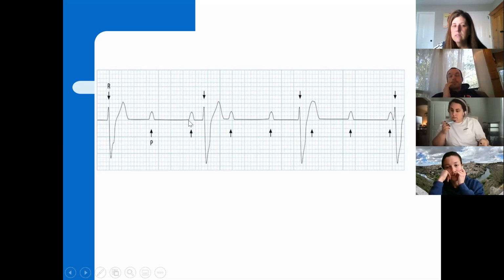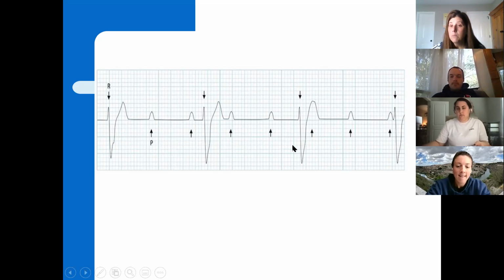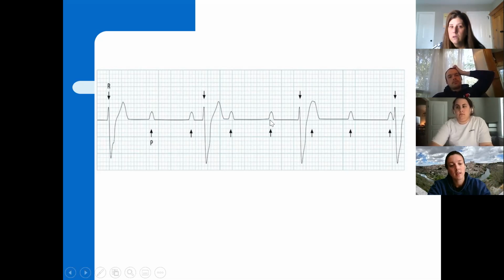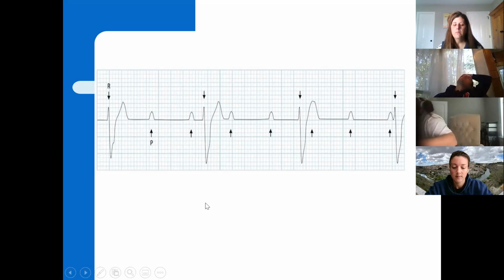And you have to notice that the PR intervals are not progressive like they were when we saw them in second degree type 1, longer, longer, drop. We have a lot of QRSs that aren't coming through. But again, it's because they're functioning independently of each other, the atria and the ventricles. But we do have random lengths of PR, like PR here. There's no way to measure this one because there's no QRS. This PR is long. This one, I can't really say that I see it, but again, there's no QRS. This one's long, and then here's another P. So they're functioning completely independent of each other.